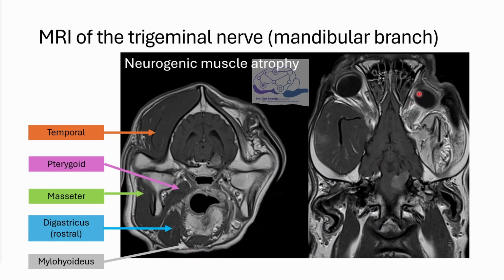And likewise in this dorsal image here, we can see this very large temporal muscle, and complete absence down to just fibrotic neurogenic atrophy. Neurogenic atrophy often has that increased signal, as you can see here. And this is that trigeminal nerve root tumour.